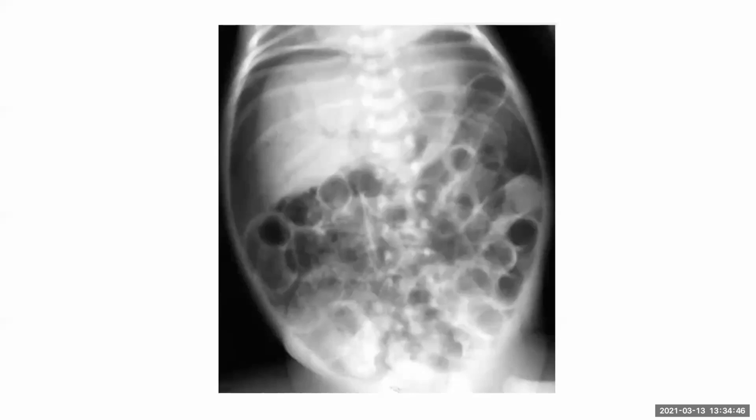So I'm just looking for any specific area of pneumatosis in this child. It looks like in the left lower part of the abdomen, there is some pneumatosis. So in a neonate, this most likely represents necrotizing enterocolitis with perforation. And this is an emergency that needs urgent surgical intervention. So I would call the pediatrician about the finding for urgent pediatric surgery intervention.